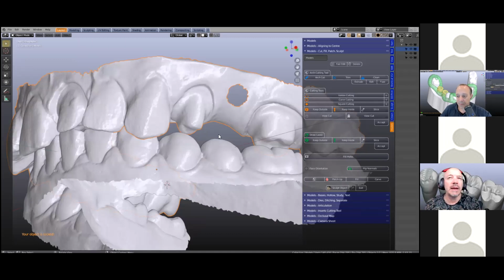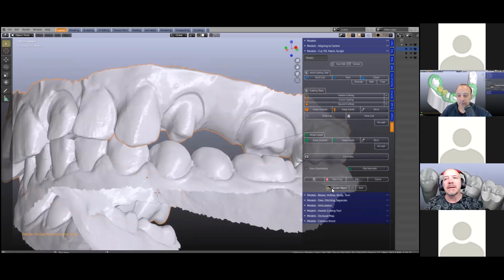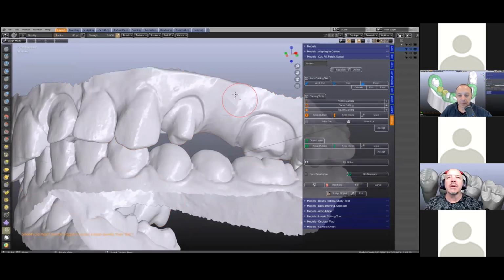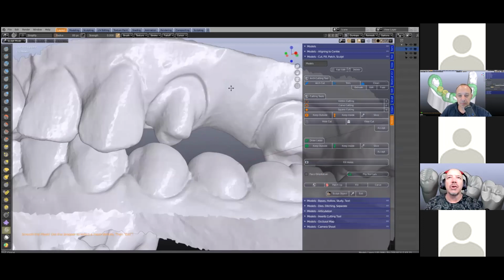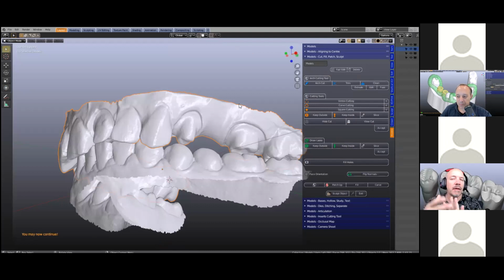If it's too big, we can still fill it, but we're going to do a bit of scaffolding, I'll call it. So we're going to click on fill holes, and that will fill up this hole like you've seen here. It's a very simplistic mesh. I do recommend sculpting over that, which will then make it uniform. If I look at the mesh now, we've got a uniform mesh structure again. That's quite important, especially if you've got filling curves and corners.